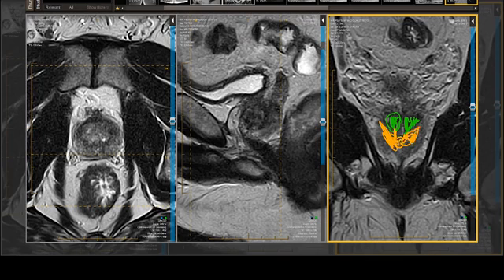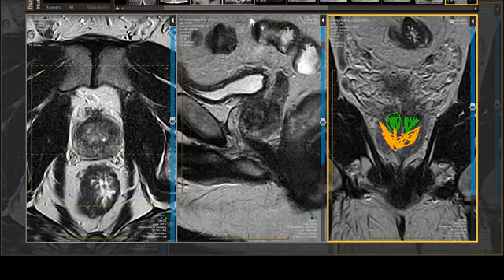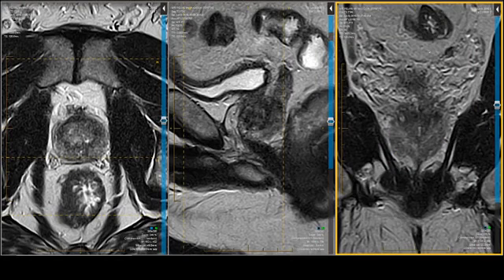And then unfortunately, in this particular person, there's not a lot of discriminatory signal between the central and peripheral zone in this projection. We're going to see it a little better as we come forward, but we're volume averaging a little bit of the peripheral zone with the central region of the prostate. I'm going to give it the color purple, but it would be kind of down here if we could discriminate it. And granted, we can't, but we're going to use the other projections and keep going. Life isn't perfect. Get over it. So here is the coronal.